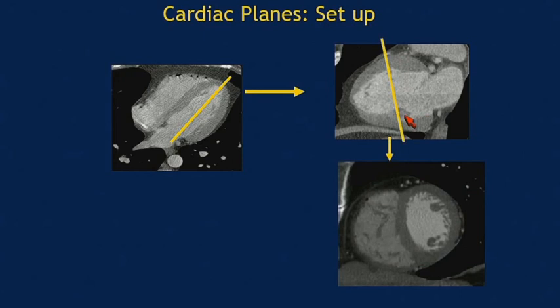It's not a very true short axis because it's been made of a single plane, so we want to tweak it off the other long axis view as well. But for now, let's just keep it as our standby short axis view.